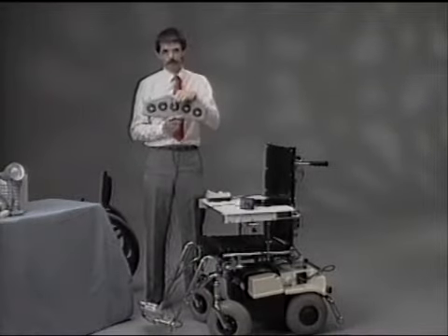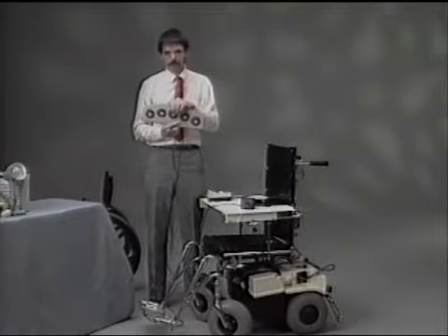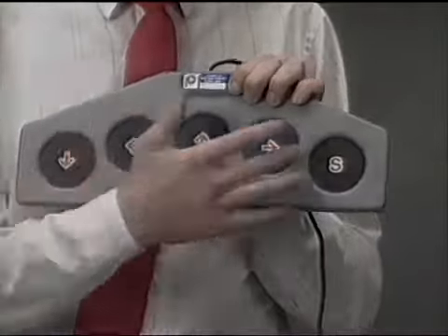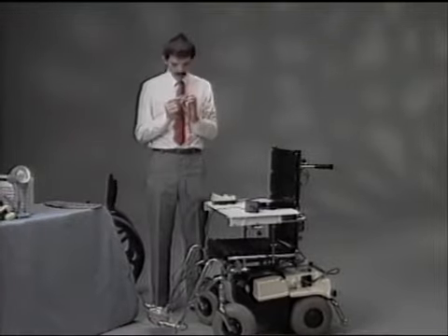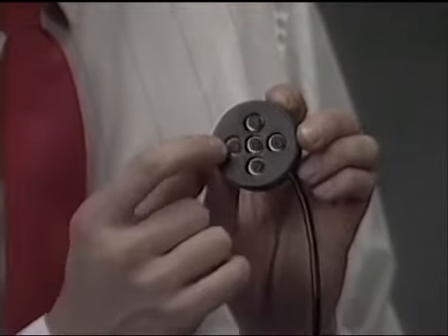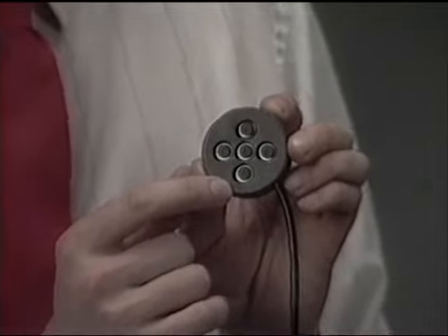In this one, when you want to go forward, you push the forward arrow. The harder you push won't make any difference in the speed you go. You'll just continue forward at one speed in the forward direction. And there's one for each other direction and one for reverse. On this joystick, the little orange mark here designates the forward position. The center is the fire position or the select position. And then we have other different directions to go in.